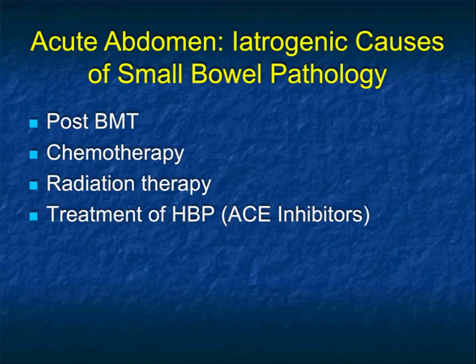Typhlitis I mentioned, but that's typically cecum, may involve the small bowel as well. We could talk about other things that relate to the surgery itself, ischemia if vessels are occluded, but that really isn't the medication side of things and the treatment side of things. So hopefully this has been helpful to you. Again, it's a pitfall. If you don't think about it, you won't make the diagnosis. But if you think about it, you may make the diagnosis and really help that individual patient.